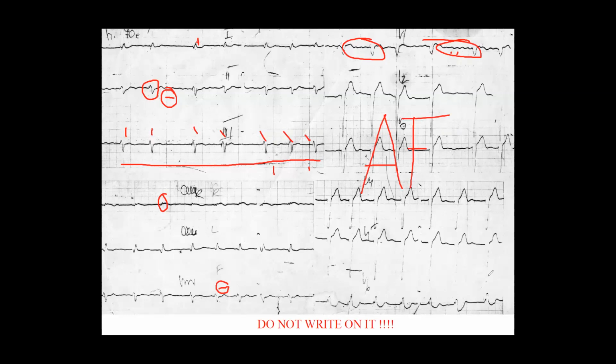Atrial fibrillation. Immediately. That could be a big mistake if you are a physician and you are not discovering an atrial fibrillation. Immediately, let's assume atrial fibrillation. Of course, if you feel the pulse of the patient and it is completely arrhythmic, you can say that's fibrillating.